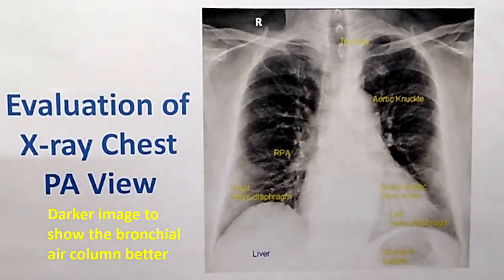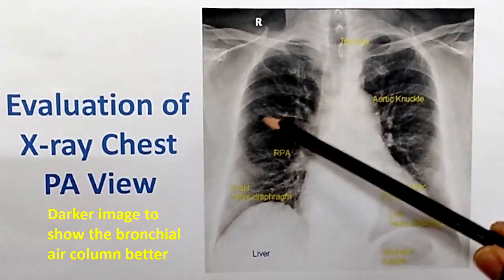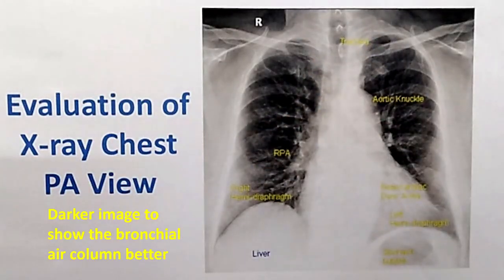Subcutaneous emphysema can be missed easily unless you look specifically for that. And in rare cases, there could be mediastinal emphysema or pneumomediastinum, which have to be looked for specifically. Otherwise, you're going to miss it. Then in the ribs, you look for rib erosions on the lower borders of 3 to 8 ribs on both sides. Those are the things which you are likely to miss.